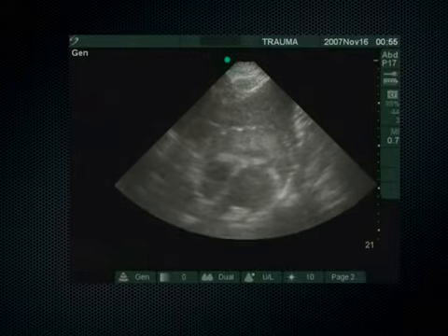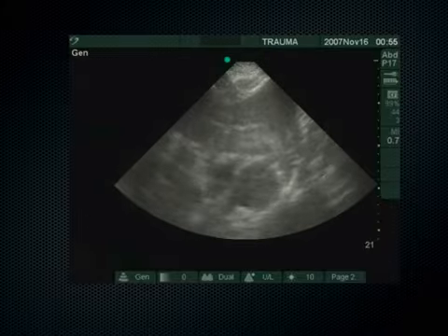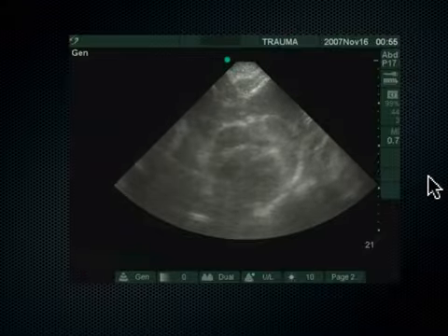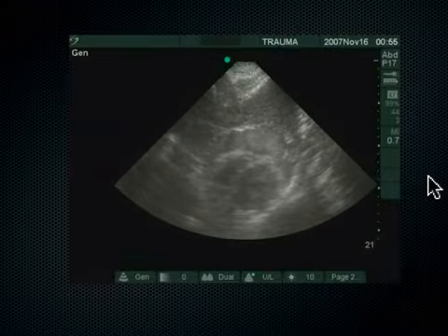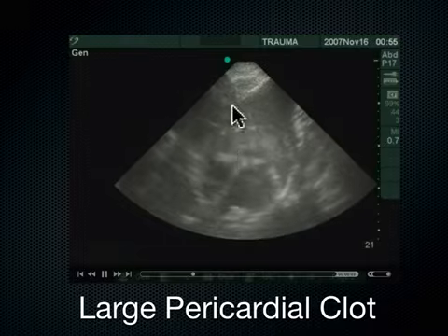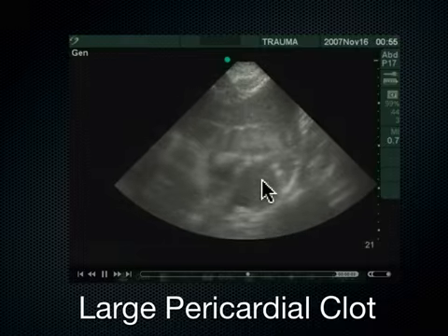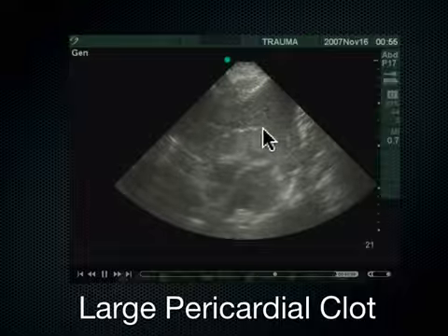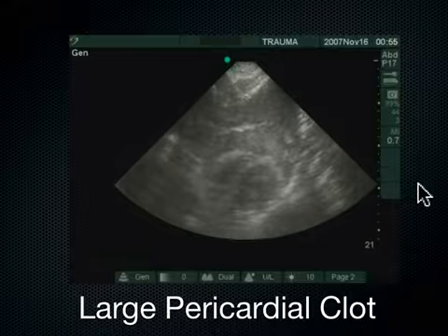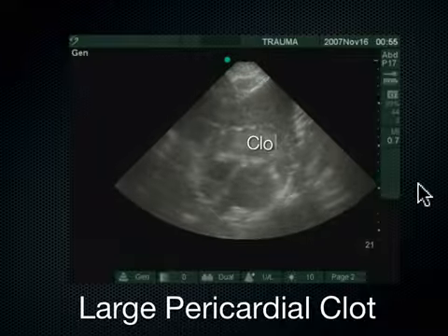What's the diagnosis? Yeah, I like that. Tamponade, why? Huge clot there. So if this is the liver and this is the right ventricle, left ventricle. This is what view of the heart? Subxiphoid. The pericardium's out here. This is all isoechoic clot. If this happens, and we see this in our trauma bay, what do we need to do?